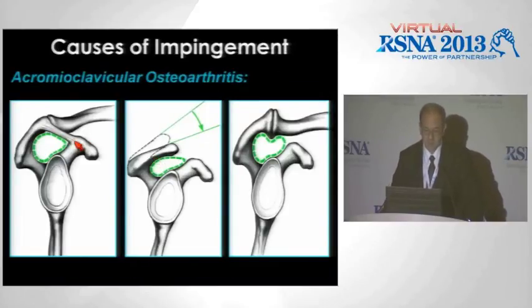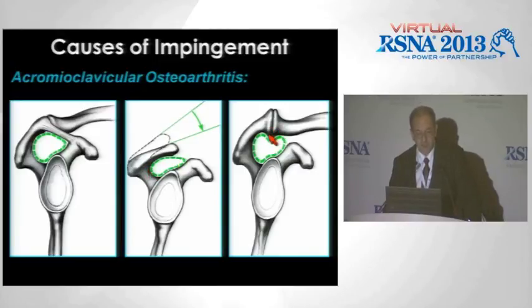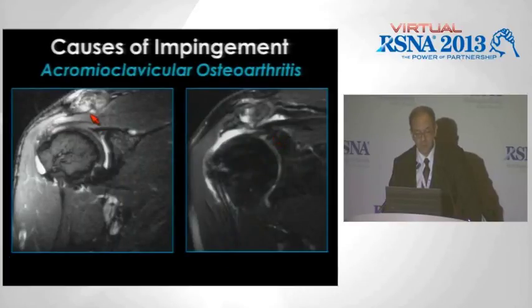So let's talk about that subacromial space, where the supraspinatus and infraspinatus lie. This is normally a nice rounded space with a good bit of distance between the acromion and the humeral head. Now, positioning of the acromion can influence the space. Theoretically, acromioclavicular spurs can also narrow that space. But if you look at where the AC joint is positioned, the acromioclavicular joint and its spurs are positioned in the muscle of the supraspinatus.